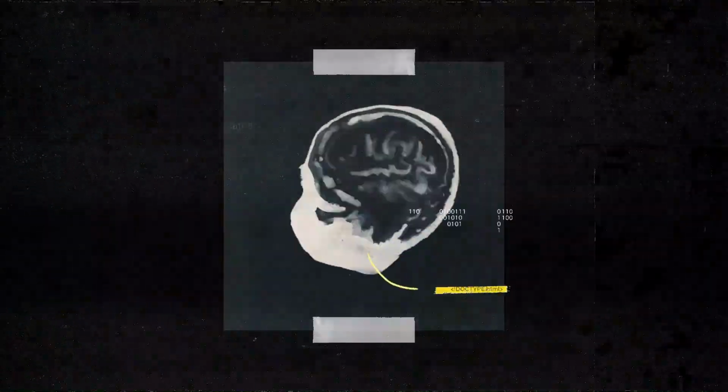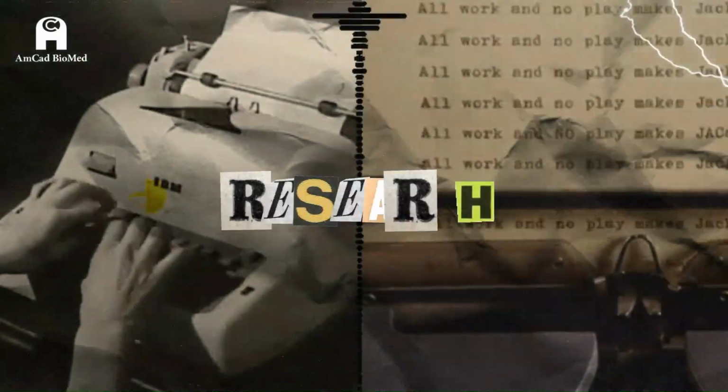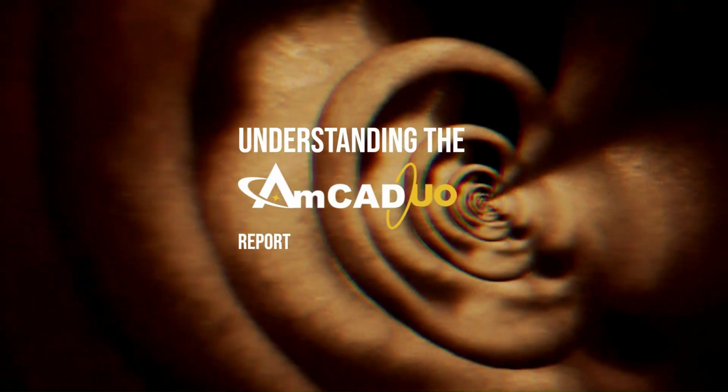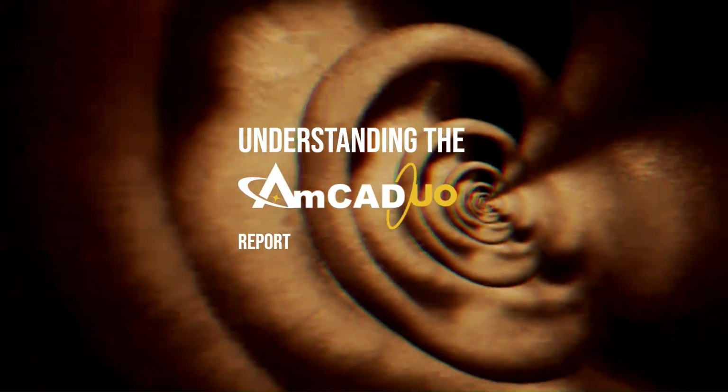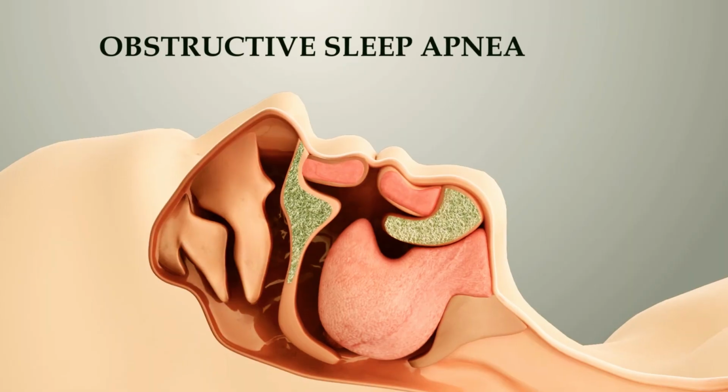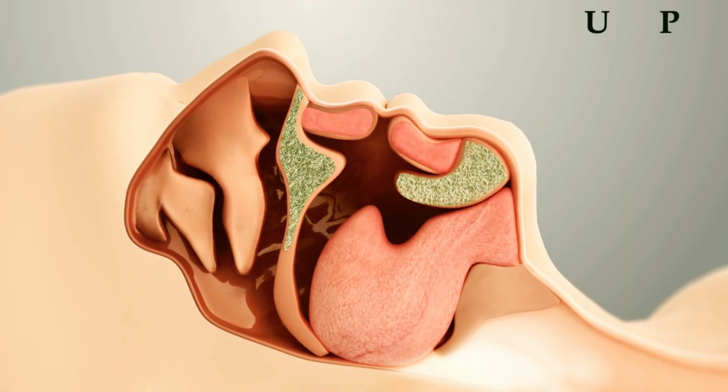In this video, we'll explore the AmCAD-UO Report, an ultrasound AI assessment designed to evaluate your risk of obstructive sleep apnea, OSA. You'll see how the report analyzes airway obstruction sites and guides treatment decisions. OSA is a common but serious sleep disorder.